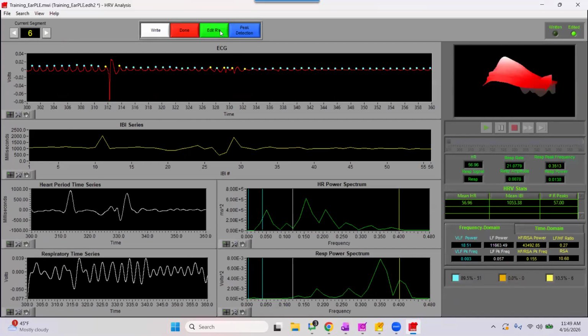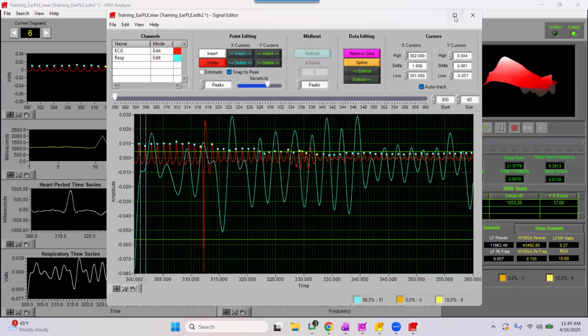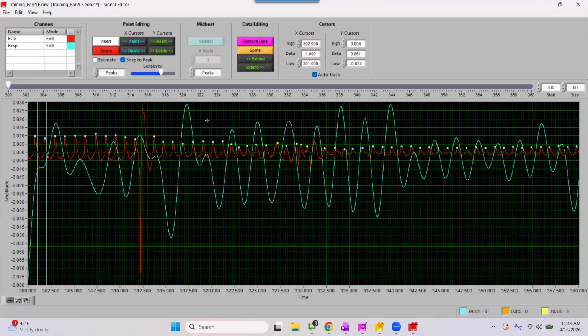One other thing that I wanted to highlight here is in segment 6, where we have more severe sections of movement. Here, we are looking at data that looks really, really small. The only reason for this is because we are auto-scaling our y-axis in order to accommodate this very large piece of movement. Other than that, we have a lot of blue dots on our pulses, some movement and maybe some things to resolve in the middle. But generally, it did a good job of identifying these pulsatile systolic peaks.